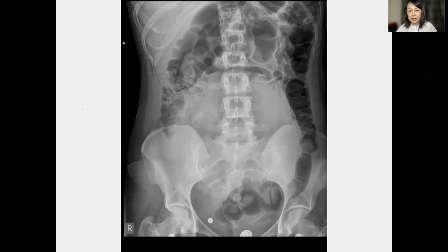Somebody said perforated bowel, left psoas tumor. No post-op history. How old was the female? Just 17 or 18 years old? Okay, now 18 years old, female patient, acute abdomen, very painful.